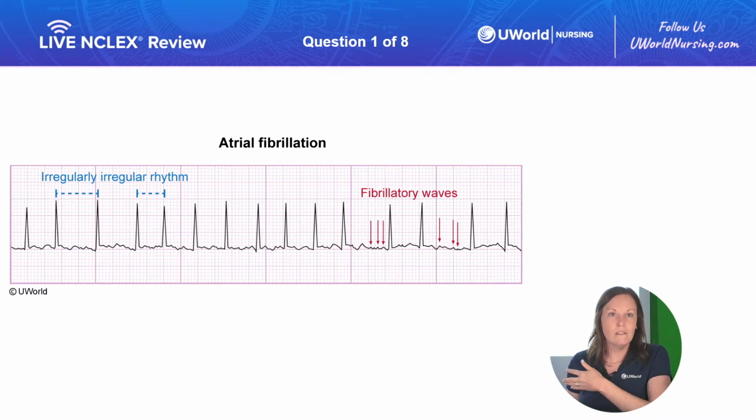Again, we see those fibrillatory P waves. We're not having succinct communication from our atrium down to our ventricles. We're not fully contracting the atrium, so we have this slow swirl, a pool of blood in our atrium. That's what increases our risk for thrombus formation. So good work on that one, guys.